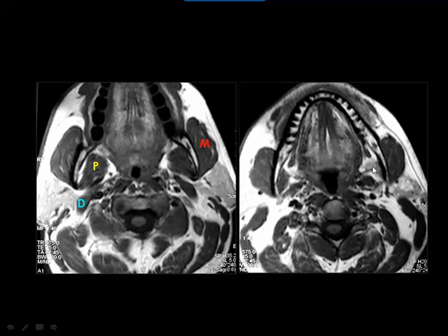Then this is a very important section in the region of the mouth floor, because it shows one of the important anatomic landmarks here, which is this muscle. And this muscle is known as the genioglossus muscle, or let us refer to it by the letters GG. Then genioglossus or GG is an almost paramidline structure, and there is another one on the opposite side.